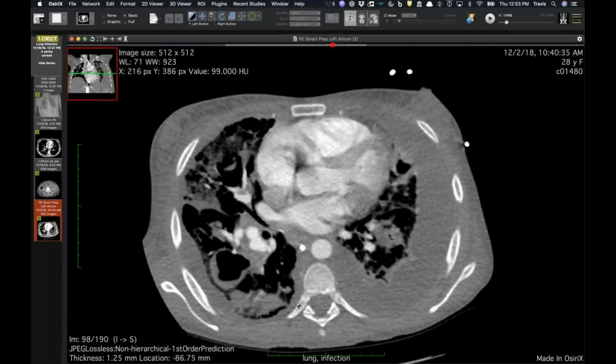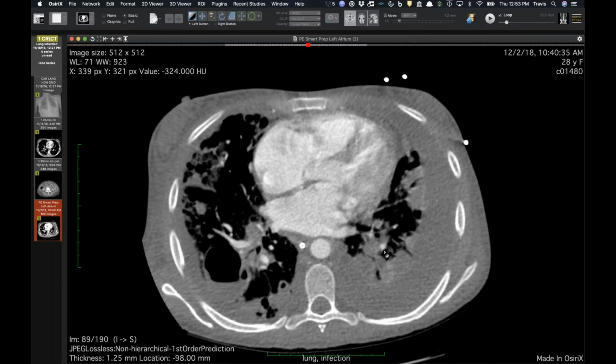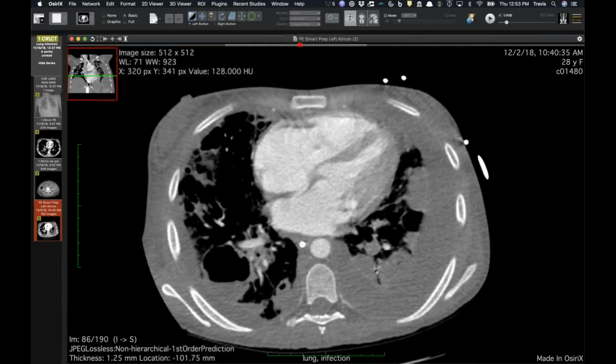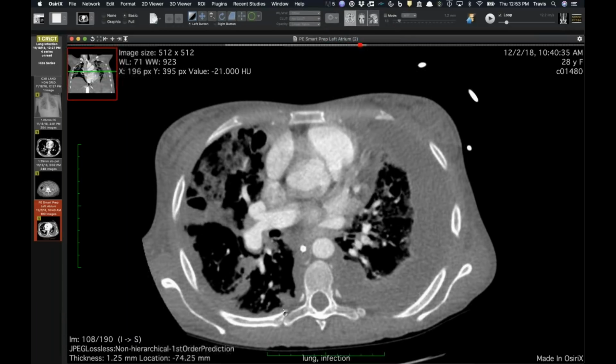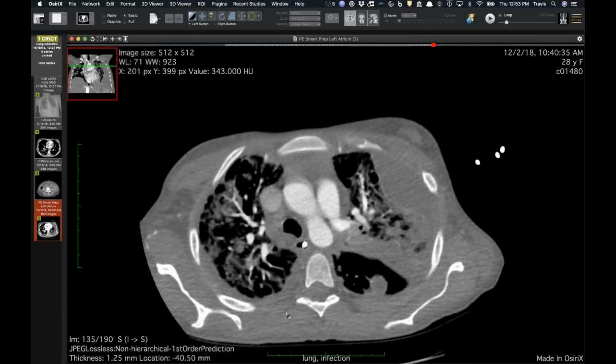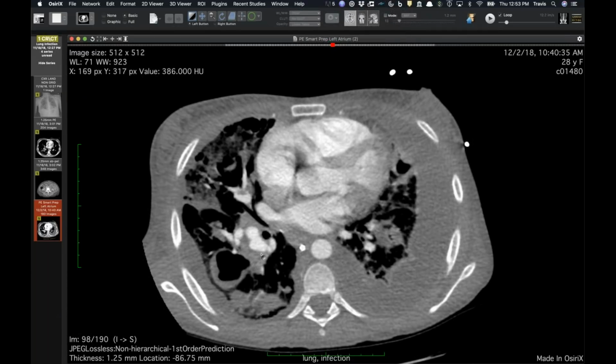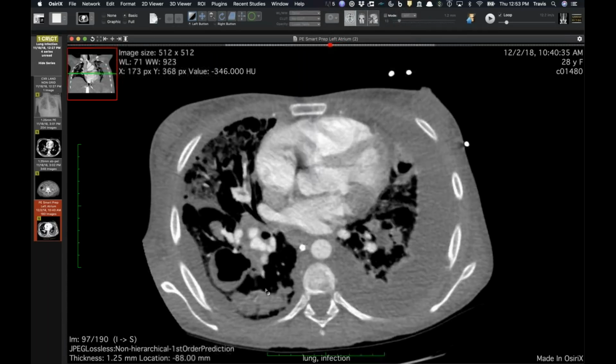So there are some of these we've seen treated with coil embolization. I think somebody else showed one not too distant, where it was coil embolized. So she's actually doing better now. She had a tricuspid valve replacement. They're just watching this to see if it continues to grow in terms of it being a pseudoaneurysm, but it's been stable so far.